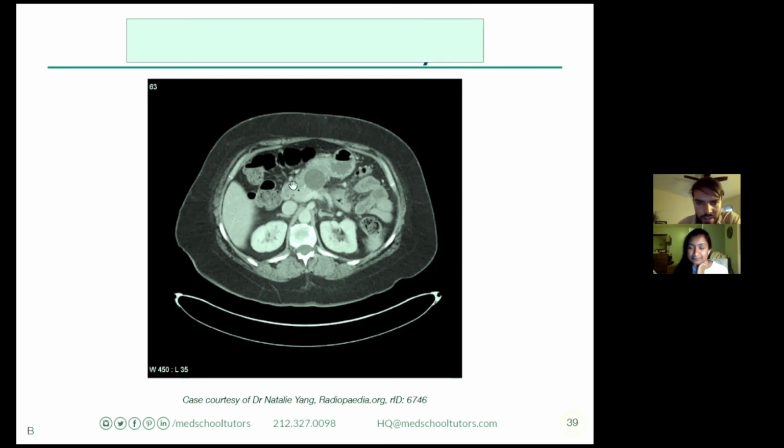And what's this perfectly circular thing? I think that's always something that jumps out at you when you see something perfectly circular. And I'm thinking, oh, is that a blood vessel, being perfectly transected? No, that's not where my aorta or IVC should be, and it's a little bit bigger than that. So that makes me think if it's circular on 2D, that it may be a sphere, and that makes me think about things that would be spherical. So what are people thinking here?